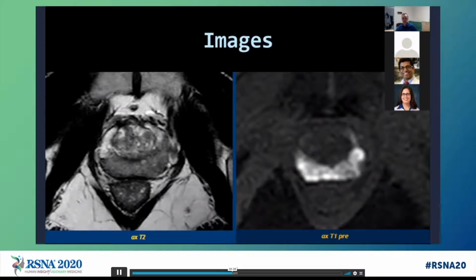And it's definitely a little bit more challenging when you have hemorrhage throughout the peripheral zone like this. It could definitely potentially obscure some lesions, as we kind of talked about in the case prior. But sometimes it helps you a little bit, like this case, if you have an area that is masked out by that hemorrhage, it could be helpful. Yeah, the hemorrhage exclusion sign, although you don't necessarily want to have to rely on that. Correct. As the only means.